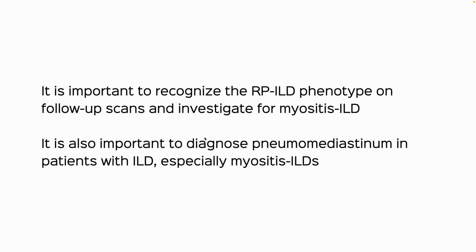So it is important to recognize the RP-ILD phenotype on follow-up scans. This is for radiologists. And to investigate for myositis ILD aggressively. It is also important to diagnose pneumomediastinum in patients with ILD. Again, there is a prognostic relevance to this, especially the myositis ILDs.